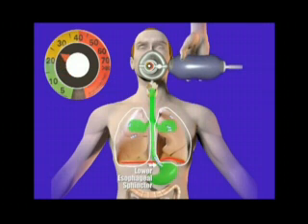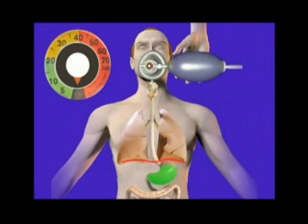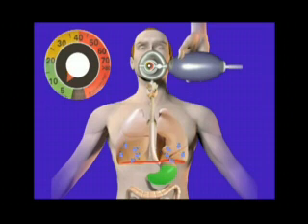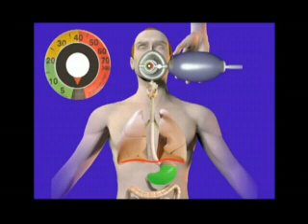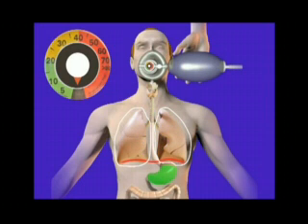It is not uncommon to achieve a completely successful resuscitation, only to have the patient end up on a ventilator several days later due to aspiration pneumonia. Having an integrated pressure manometer on your resuscitation bag is an effective tool that allows caregivers to monitor and control delivered inspiratory pressures during manual resuscitation and ventilation. Monitoring and controlling airway pressures during manual ventilation minimizes the occurrence of life-threatening complications, leading to improved patient outcomes and greater survival rates.